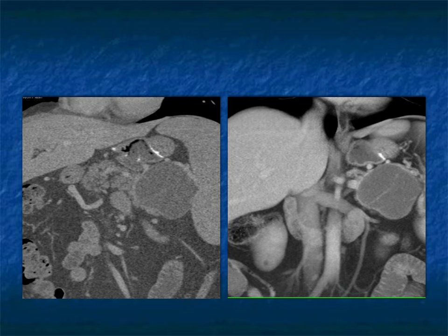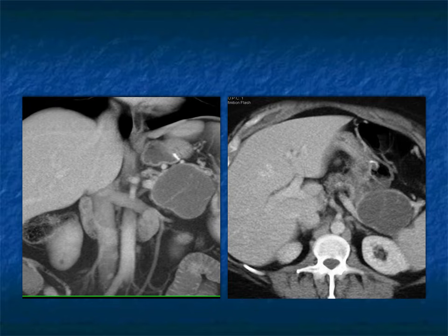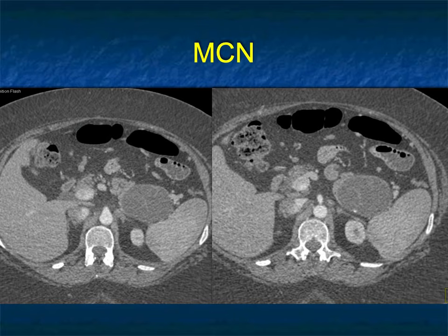You can think about serous adenoma. You could think about an MCN. You could think about a lymphoepithelial cyst. But you really got to be thinking most about an MCN. Again, patient's age is helpful. And this was an MCN with low-grade dysplasia.